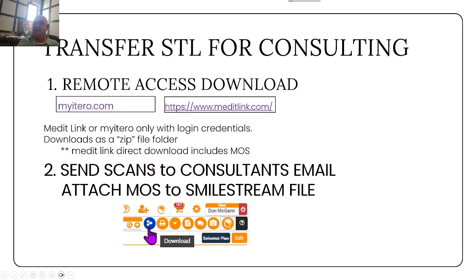So you're going to send the scans and the Medit Orthodontic Suite to a consultant's email. And in SmileStream, we can also use this little download button here. We can attach an MOS file to the patient's SmileStream file. And then when you send out SmileStream, I can download the scan. So that is available also.